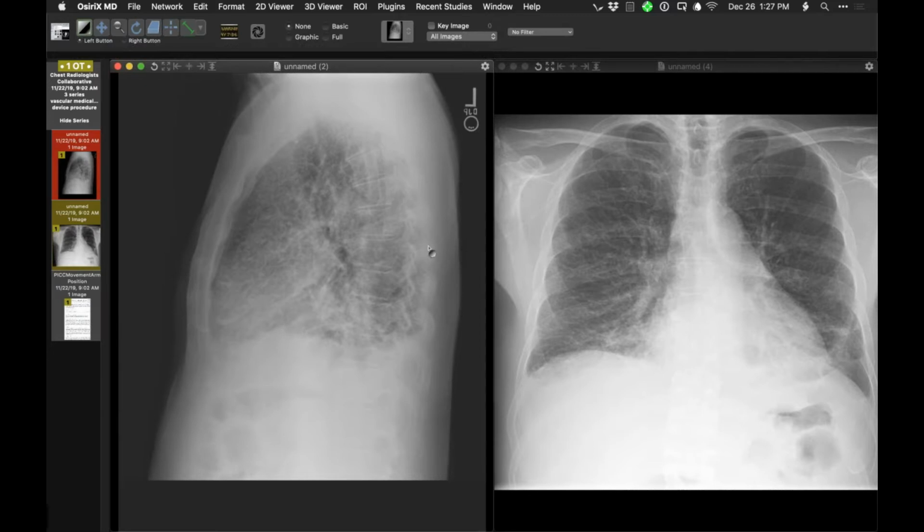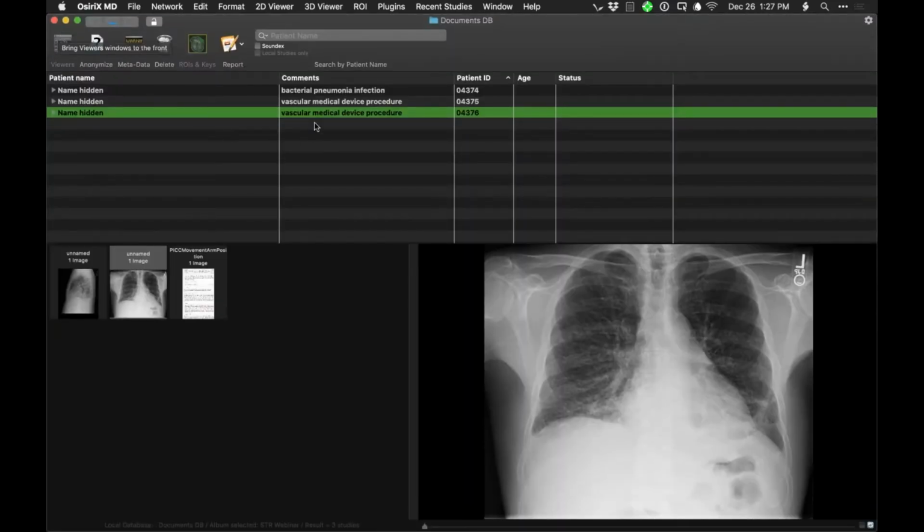So I don't know what to make of this particular one. Went in the wrong direction. And I don't have a radiograph in follow-up, so I don't know what happened after that. So go figure about that. But the flip with the injection of contrast is something one can find case reports of. So that's kind of a known thing, one I showed you before.